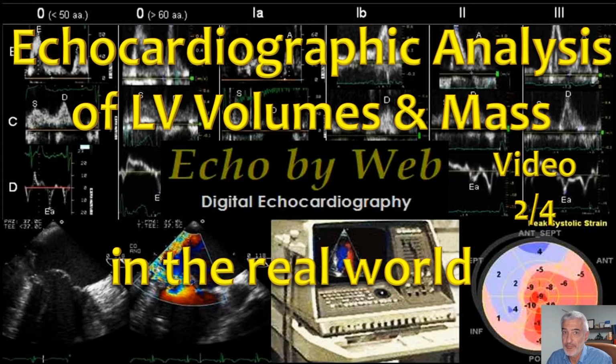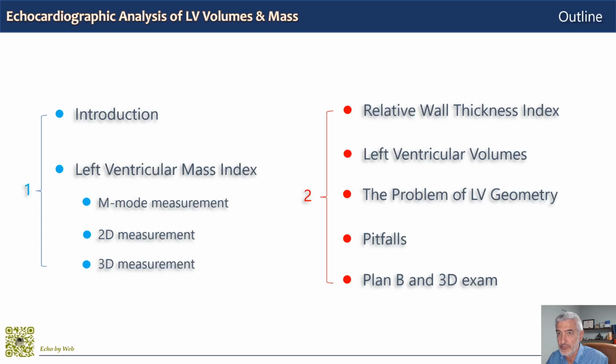The topic of the present talk, which spans over 2 videos, is the echocardiographic analysis of left ventricular volumes and mass in the real world, and this is a basic approach. In this talk, we're going to review how to measure left ventricular mass index and the relative wall thickness index by looking at M-mode measurements, 2D and 3D measurements.